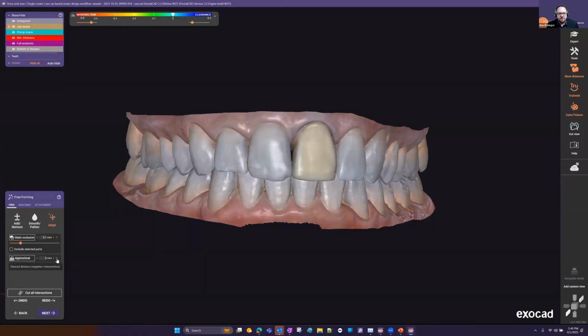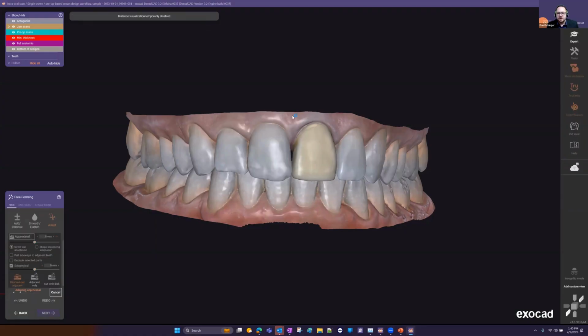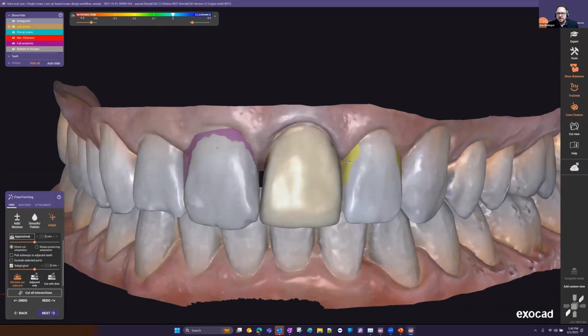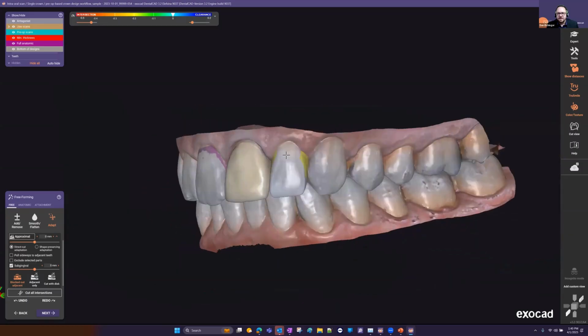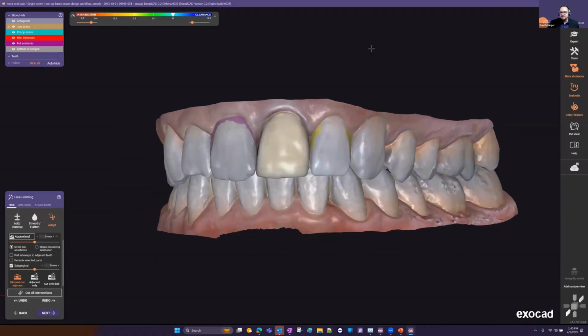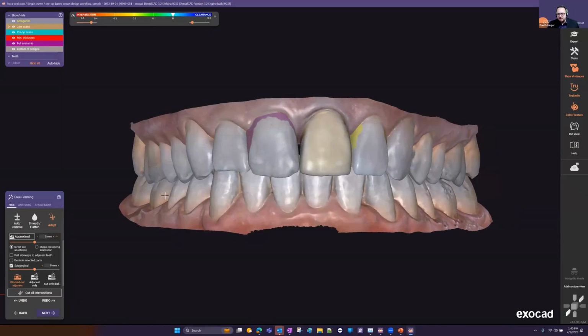Now, the same goes for proximal, except you're going to see more behaviors here. One of my favorites here is block out adjacent. So when you utilize that, the software is going to look at your insertion direction and basically block out areas on the neighboring teeth that have undercut. So I'm sure a lot of you that are well into your digital journey have had scenarios where, I use this perfect value that I've tested and I'm having the crown just not seating.